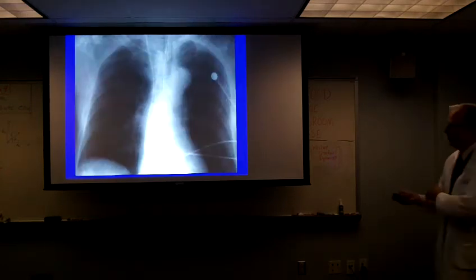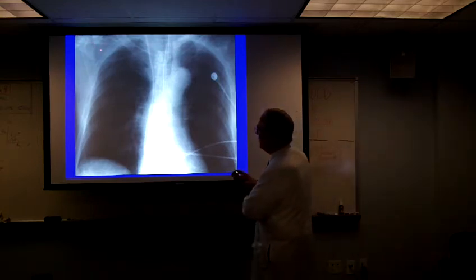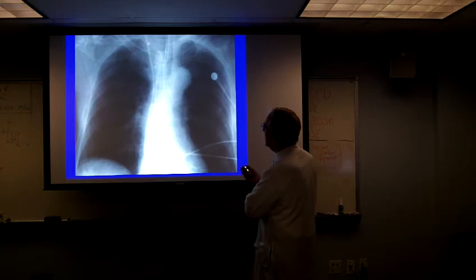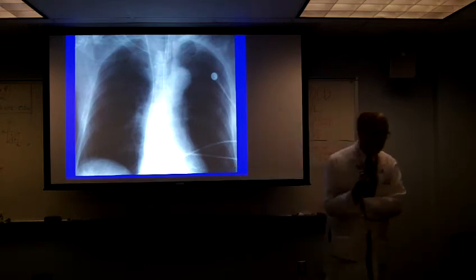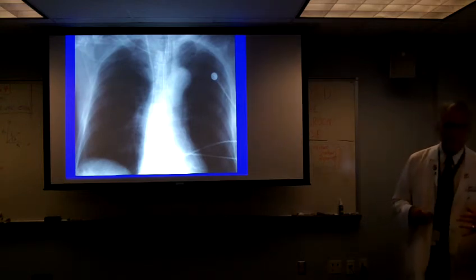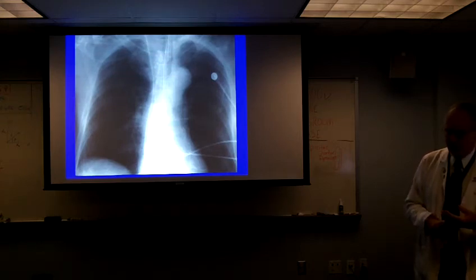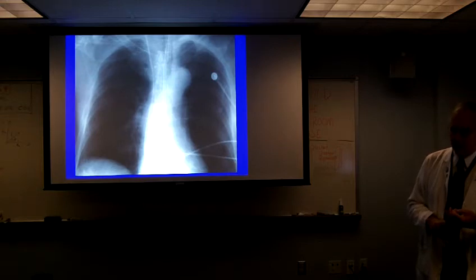This is a little bit tougher to see. This is a patient who's had an introducer sheath placed, and the tip is right here. The point I make to our residents and to the house staff is, if you're replacing catheters, you have to know the vascular anatomy well enough to know whether or not the catheter you've just placed is going in the appropriate spot.